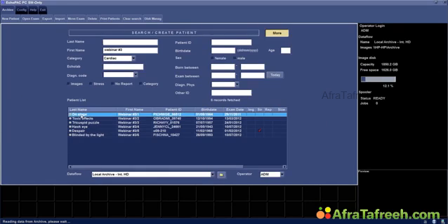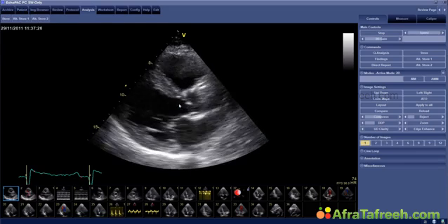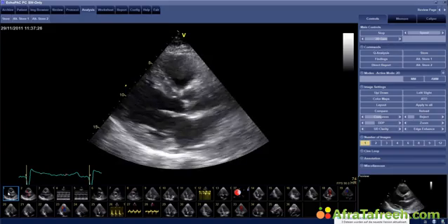But I'll show you the images that I made, because he was dismissed from the hospital, a bit better, but still with dyspnea and pain. And he arrived at my office, actually, with still the same complaints, and wanted to know what the problem could be. So those are the images. What I'm going to do is I'm going to show you these images now with not much comments, and then I'm going to ask you a question.